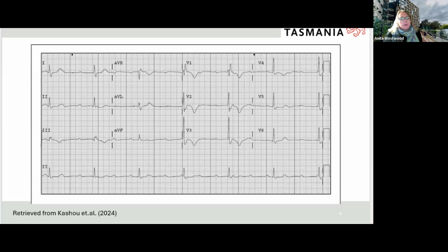You want to look at it like there's two horses in this race, the atria and the ventricles, and neither of them, it's like there's a dance party upstairs in the atria, and those complexes cannot get through to the ventricles. That's the definition of a complete AV block. So you measure on that bottom strip, look for the pattern, and those P waves should be regular because they're firing off. But the problem is, if they happen to land next to a QRS, that's just by coincidence. They did not cause that QRS.